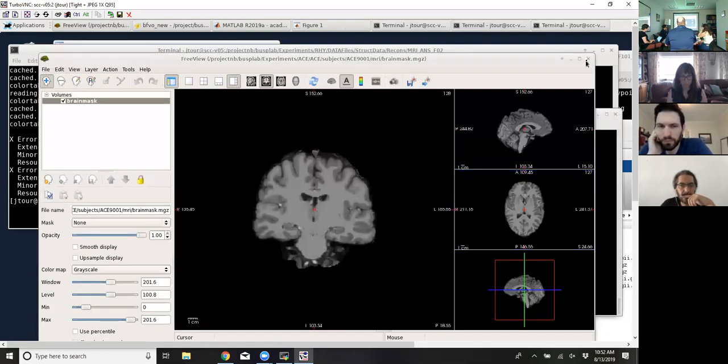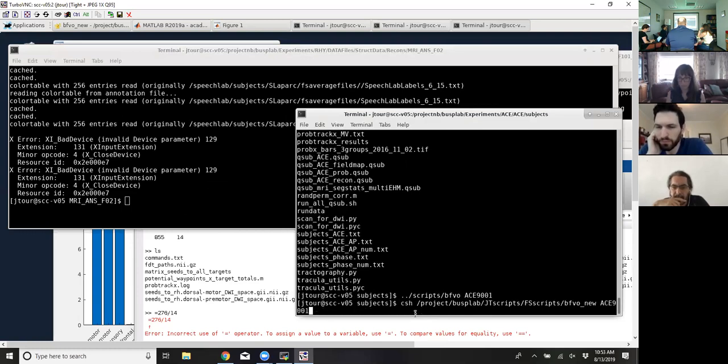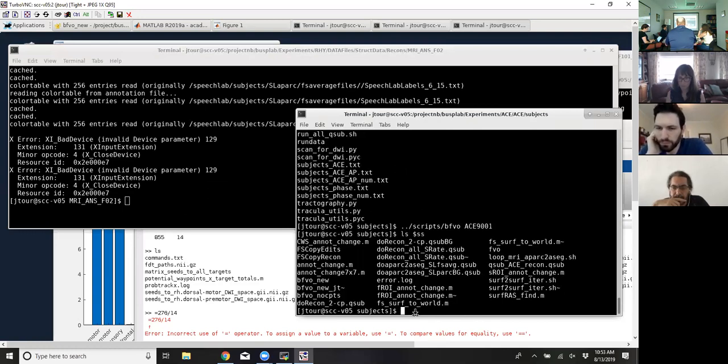So, Alfonso, do you know what the difference is there? It's essentially the same script. If I directly address it like this, I say, go back a directory, go in here, grab this script, and then run it, I can do it like that. But if I am using an environment variable, so if I want to use this version of it, do you know why, when calling it to actually run it, I need to put the shell name here?